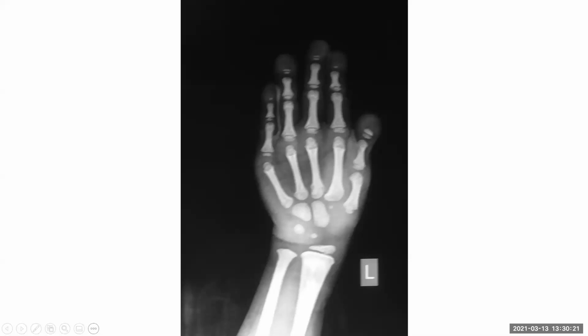Anyone who wants to volunteer to describe this, or should I just go through? No, doctor, we do have a backup, Dr. Ali. I think he can take the case. Now, we still have like half an hour to go. Yes, yes. You want to try? Yes, Dr. Ali, can you unmute yourself? Can you hear me? Yes, we can hear you. Okay.